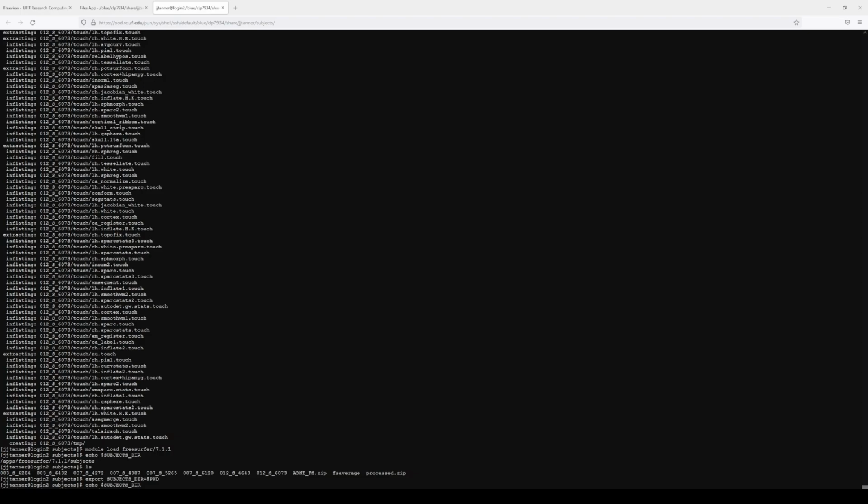Now, on HiPerGator, we're going to check output, so I'm not going to use command line for all of this, meaning we need to open up a graphic user interface. And in this case, we're going to use FreeView, which is their GUI software, the software for viewing images. But I was just showing this because that's going to be a method for running some of these quality control things. And so that could also be done in a script.